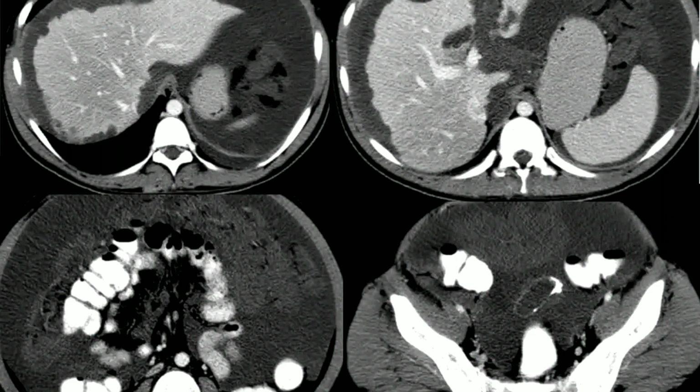My first consideration, if the patient is a female patient, could be metastatic ovarian disease with abdominal pelvic ascites. As I can see, there is a hypointense linear area in the second image. I will assess this in the sagittal or coronal images as well, and ask the history. It's a male patient. So we will exclude ovarian cancer.